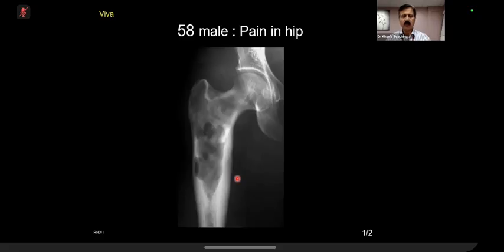Some people use contrast, and what they do is they give contrast and correlate where there is loss of high signal in the same region. If there is enhancement, that is also taken as a sign of malignant transformation. So these are the concepts. But the Royal National Orthopaedic people do not use contrast. They say that we can diagnose it just on the basis of the regular sequences.